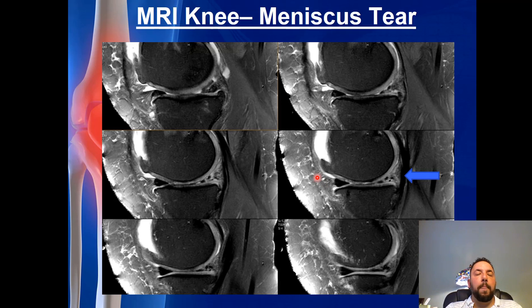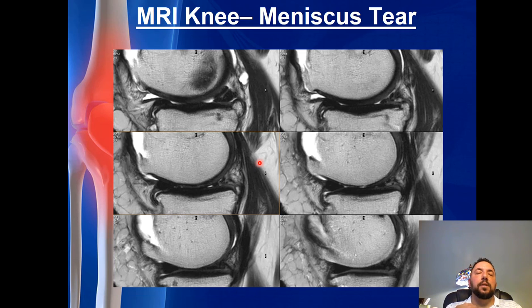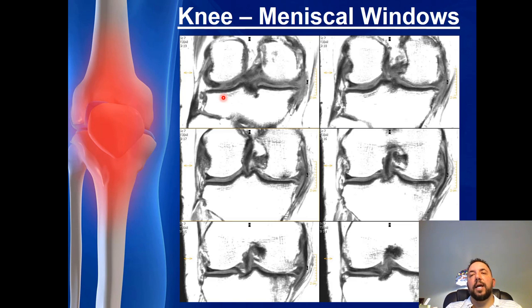So this meniscus tear, as evidenced by, you know that normal meniscus is a black triangle, and then when you see hyperintense or varying signal intensities, that's identifying the meniscus tear. Again, same thing, bright signal intensities within what normally is a dark or blackened triangular structure indicates meniscus tear. And then same here. You're looking at the abnormal signal intensities as meniscus tear.